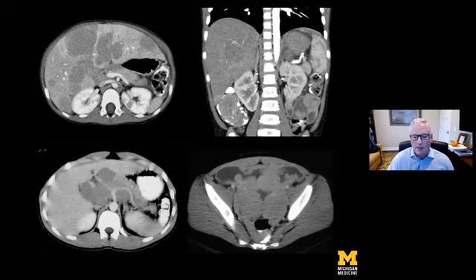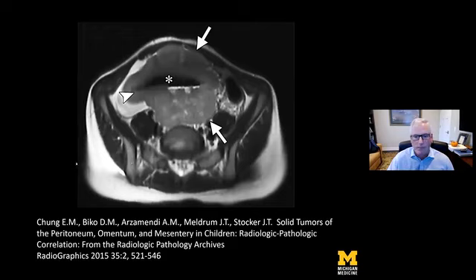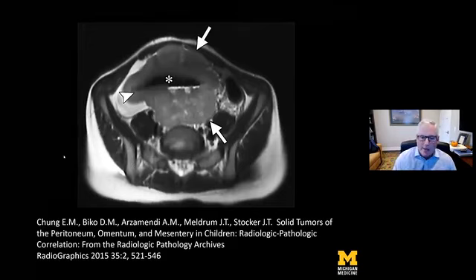And these were all cases of Burkitt lymphoma. In this particular patient, I think that many people are aware of the fact that it can involve the bowel. I've seen it involve the rectum with a very similar appearance. I did not have an MRI example.